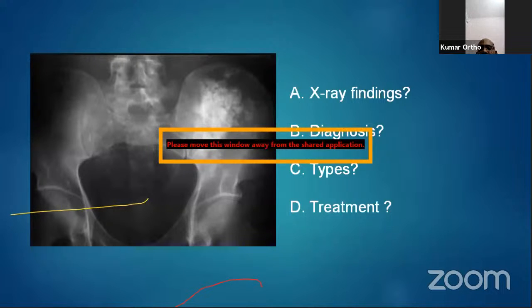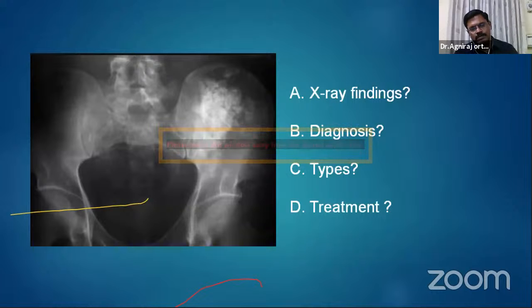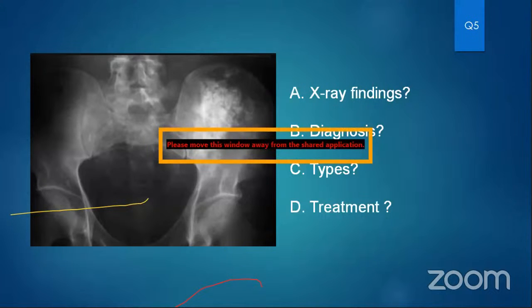It should probably be a case of chondrosarcoma. So this is called popcorn calcification. So your diagnosis is chondrosarcoma. Any other differential diagnosis? Another chondroid producing tumor, enchondroma also. Enchondroma. Okay. So chondrosarcoma is correct.